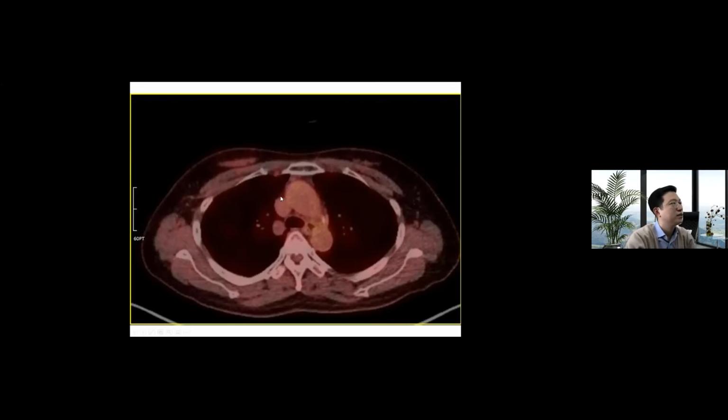In this case, I don't think it's an enlarged lymph node. But if there is an enlarged node and the uptake is kind of equivocal, then I think it would be nice to report that because they can do the biopsy for accurate staging. So that's my opinion.